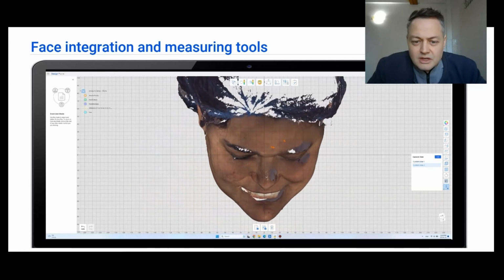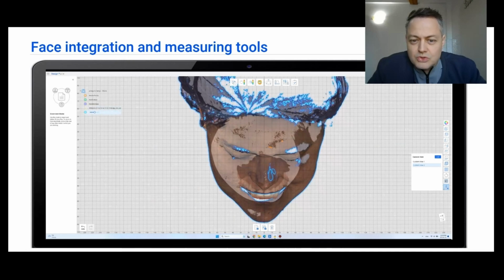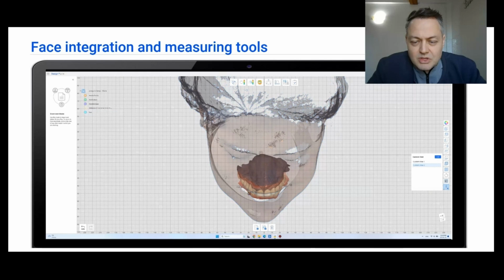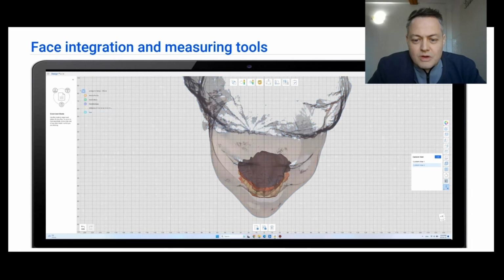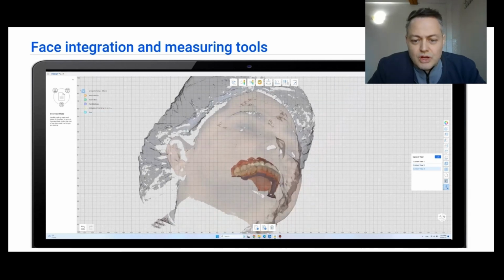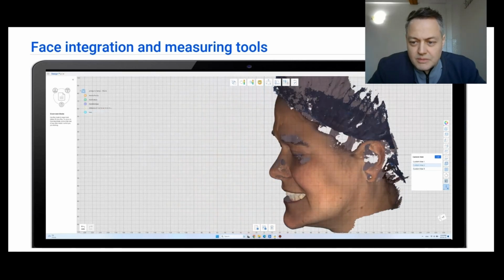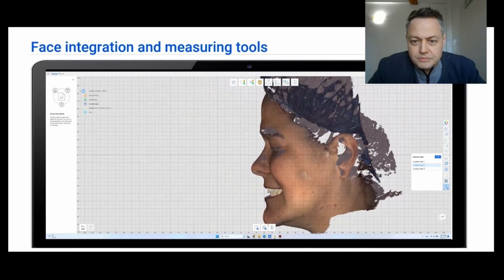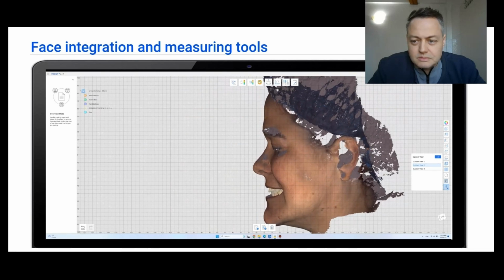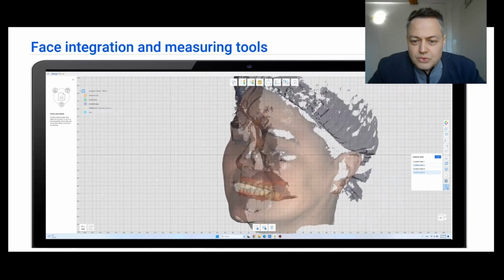I'm overlaying a grid of squares over the face that can actually help me position my meshes as I see fit for custom views, but not only for custom views, but also for wax-up design, because such squares actually give dimensions and can be used from one part to the other to actually do the same dimensions of the piece. And now just setting some custom views that will help me later. And after I've done this, I can do a transparent view.